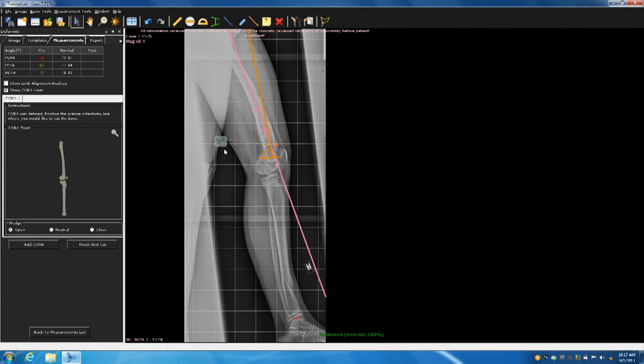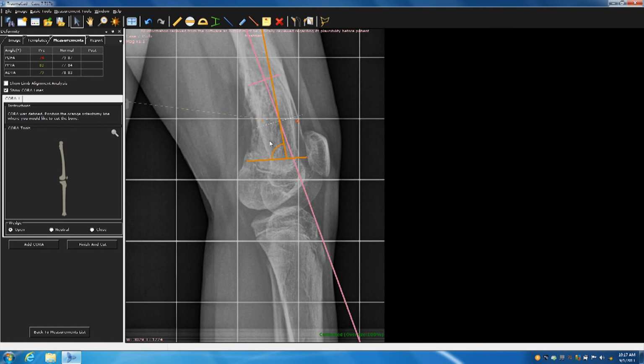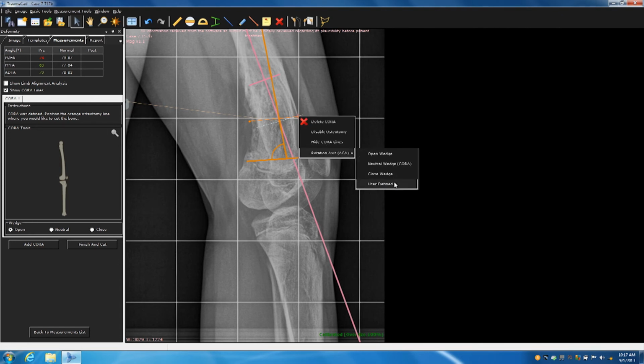Again, this little number gives you the amount of deformity, 9 degrees, and it shows you that you're creating an 83 posterior distal femoral angle. If you look, it gives you your osteotomy site, again, at the apex. For a fixator-assisted plating, I think this is very doable. And do a neutral wedge, put it right at the apex.